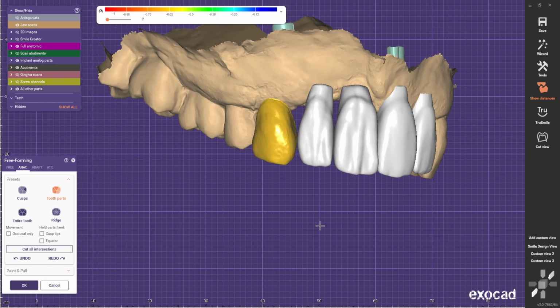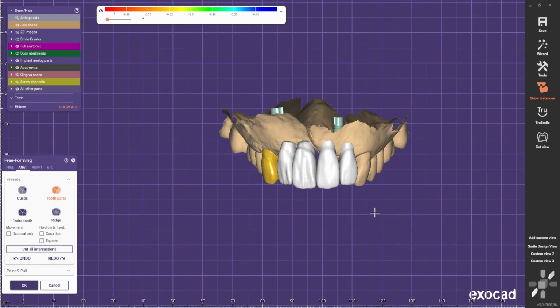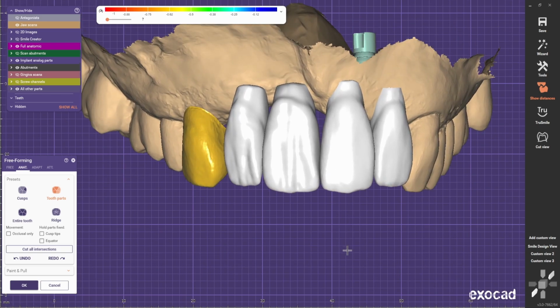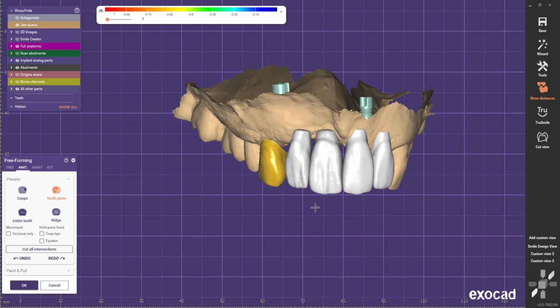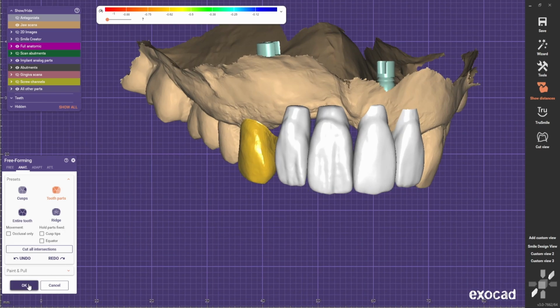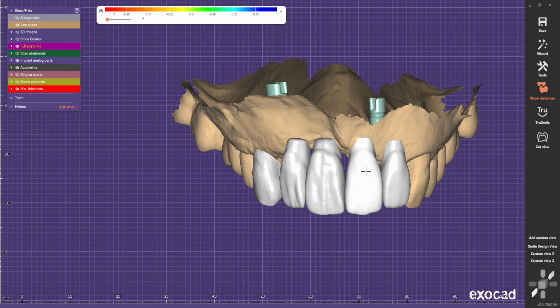We're gonna do something like this. It's a bit exaggerated, but this is the purpose of today's video: to do a heavier secondary morphology and texture. So okay, now I'm gonna copy all of them to the other side.